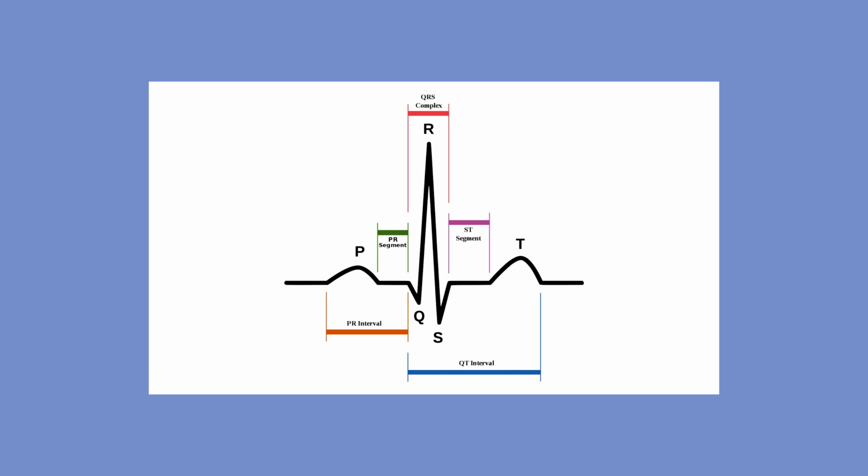Now, for the PQRST, I will be showing you a demonstration of this on your screens. Again, we'd like to make it as interactive as possible, so please join in, pause the video, and what I'd like you to do is separate the PQRST into three sections: the P wave, the QRS, and then the T wave. Think about what each area of this ECG rhythm is and what it represents. So what does the P wave show, what's a QRS complex, and what's a T wave, and then I'll give you my answers.